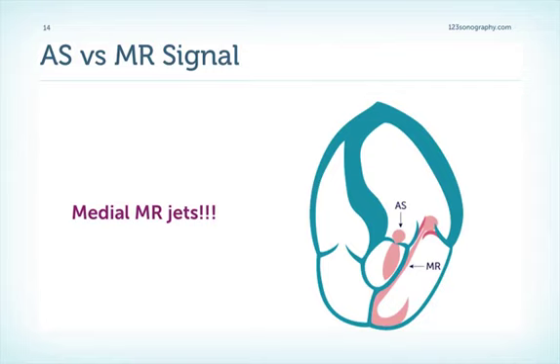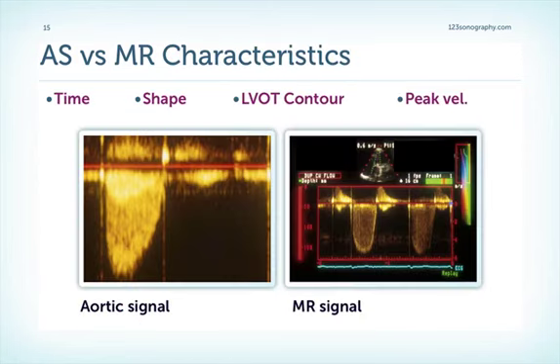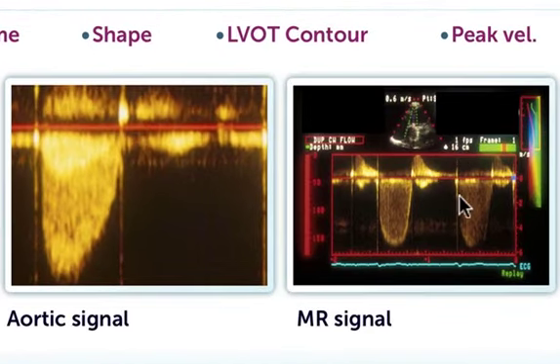However, there are some typical differences. So, aortic stenosis versus mitral regurgitation characteristics. Timing is different, for example. Mitral regurgitation is longer in duration, starting with the mitral valve closure and ending with the mitral valve opening. And looking at the signal of the aortic stenosis compared to MR, the aortic stenosis has a more dagger-shaped signal, whereas the mitral regurgitation is rounder in shape. Look here.